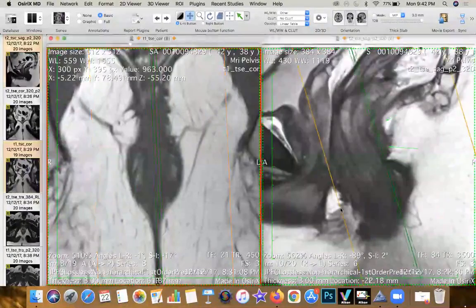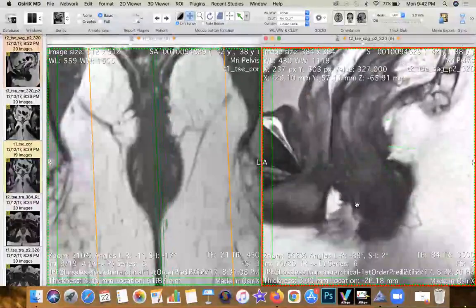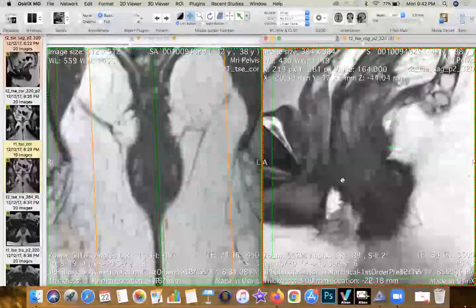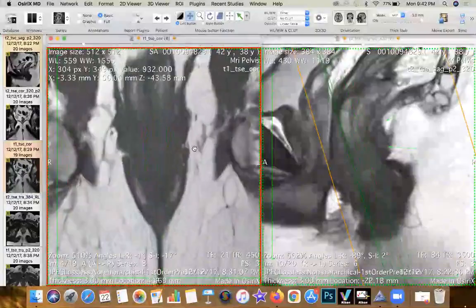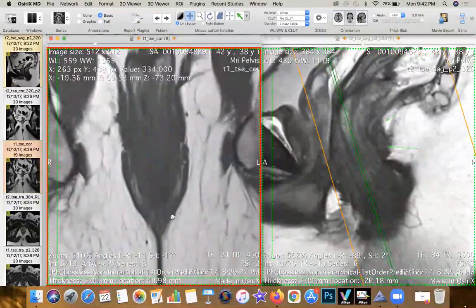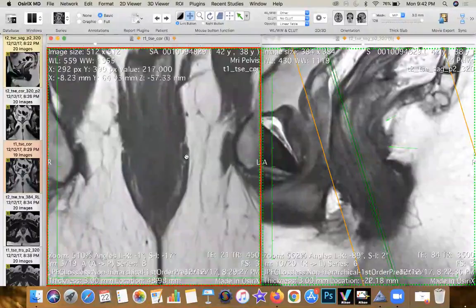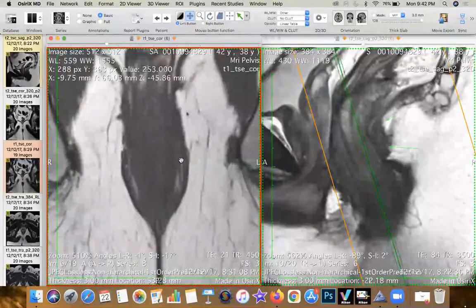The muscle fiber group just located a little more rostrally, you can see that in that gap over there, is the superficial fibers of the external sphincter, and the deep fibers are located a little more rostrally, and they tend to merge with the inferior fibers of the puborectalis itself. So if I were to look at it again: subcutaneous, superficial, and the deep fibers of the external sphincter complex.